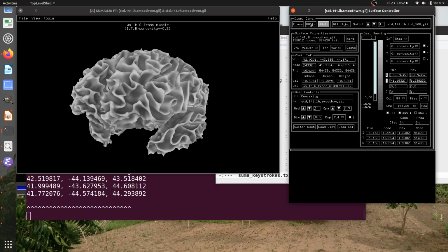Okay, well, if you go to B help and click on one of these labels, you'll get the button help of it. This help tells you about what's happening there, and we call it button help because this is a button. So if you click it, it will go away.